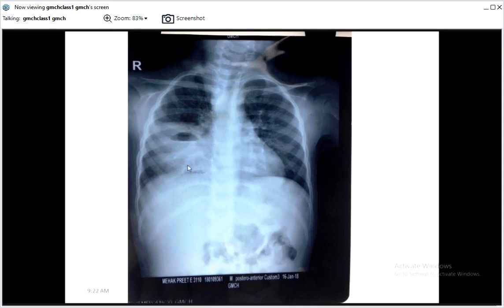So here you can see this is a radio opaque area. The costophrenic angle is clear. So here you can see a very well defined air fluid level. So this is a consolidation with cavitation in between. Okay, so there is some lung pathology, the consolidation which has been kept untreated for quite some time, ultimately has led to a cavity formation. Right side of the lung fields are normal. The angles are clear and everything is clear. Left side, sorry.